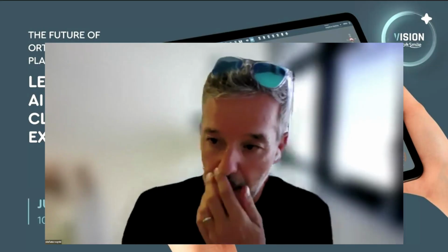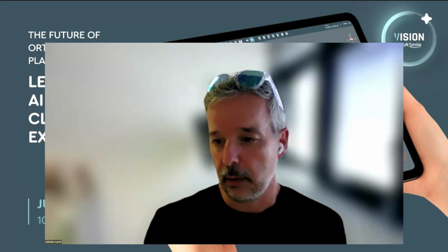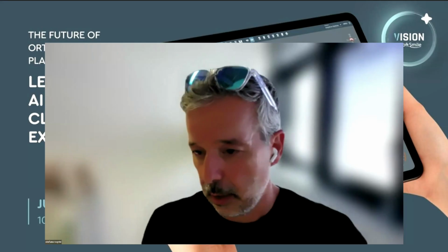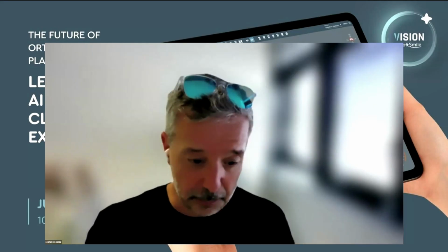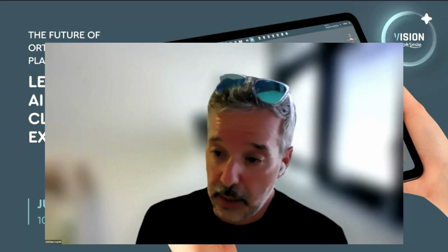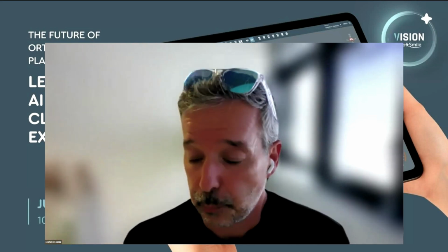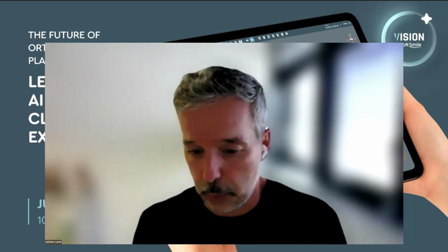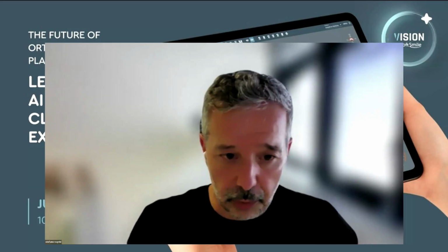My topic today is planning cases through the vision of SoftSmile, and I want to tell you about my experience. Obviously, I started a lot of years ago with different software. Right now, the progress in planning aligners has seen a lot of development, and planning is much easier compared to the past. But now I want to explain my point of view and talk with you about some options. Okay, right now I share my screen.